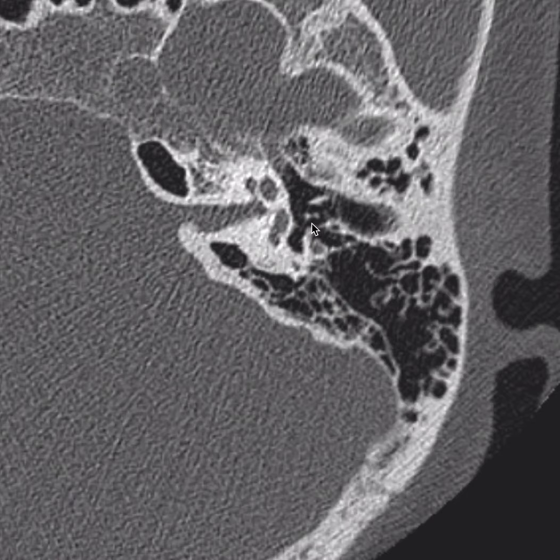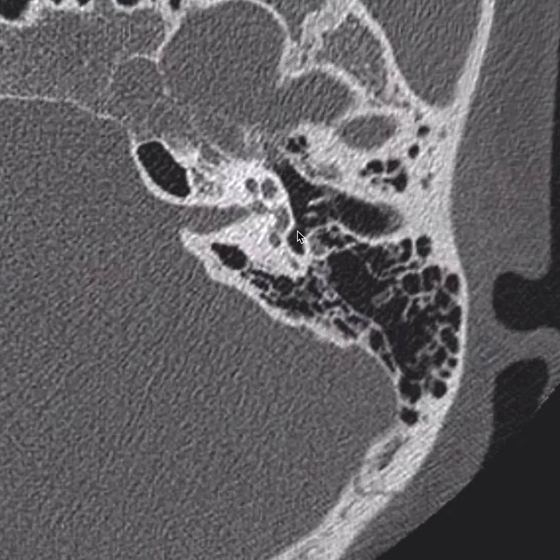The stapedius tendon is going to attach at the neck of the stapes, and then we're going to have anterior and posterior crura getting to the oval window over here at the footplate. If I continue a little bit more inferiorly, we'll see this. And then we're also starting to see this large protrusion off the basal turn of the cochlea here. This is called the cochlear promontory.